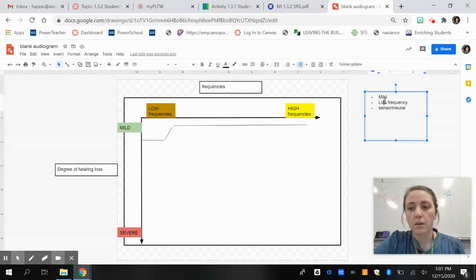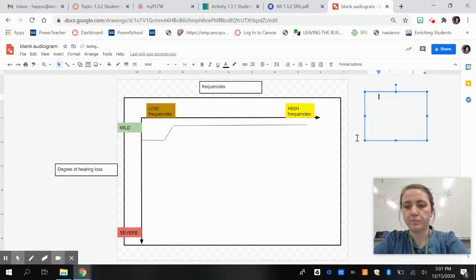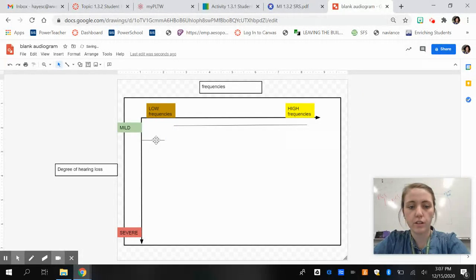Okay, so then I'm going to go back and clear all of this out. We're going to do another one.